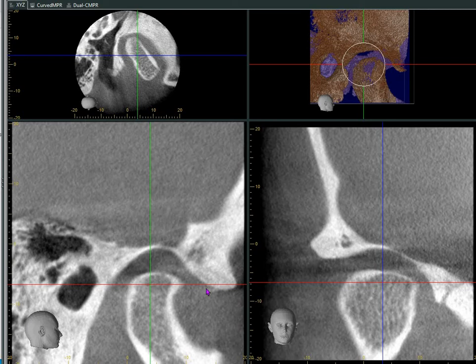In this video, we are going to cover one of the most important and key aspects of diagnosis. This video is an update on the previously mentioned proper diagnostic methods video, and we are going to go more into details about the TM joint and its anatomy so that you can see how this critical part of your head anatomy can influence so many aspects of your head. Currently, we use mainly CT scans of the joint area to help us make the proper diagnosis, and that is the purpose of this video.